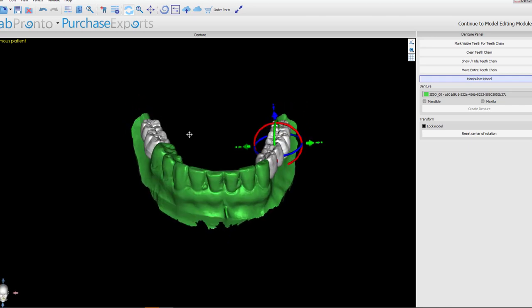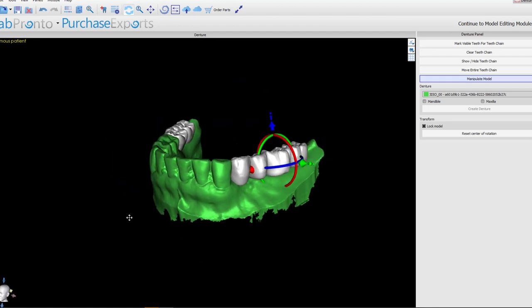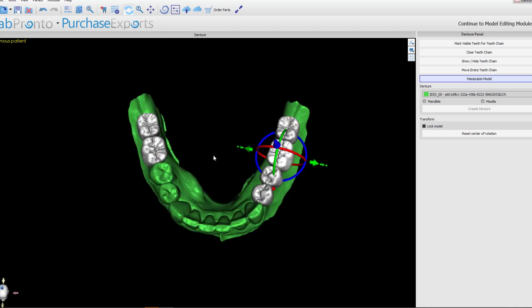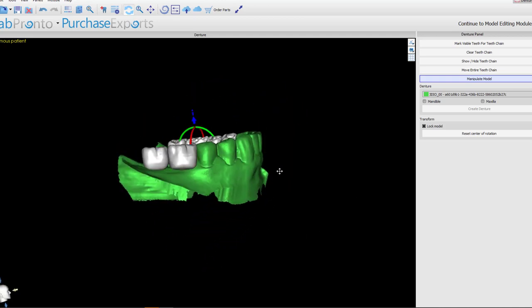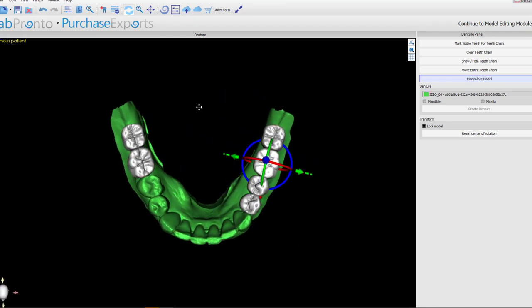But if we're going to go the extra step of creating clasps in this design, then there's a few things we need to do. Think back to your old dental school days when you used the survey table, where we would try to identify the undercuts and then pull a clasp around that just engages into that undercut. So I need to generate a model on which I could do that, because right now I would purely be guessing. And you might say, well, with a flexible partial, guessing's fine because it'll flex over it. But if we can do it a little more precisely, let's try to.